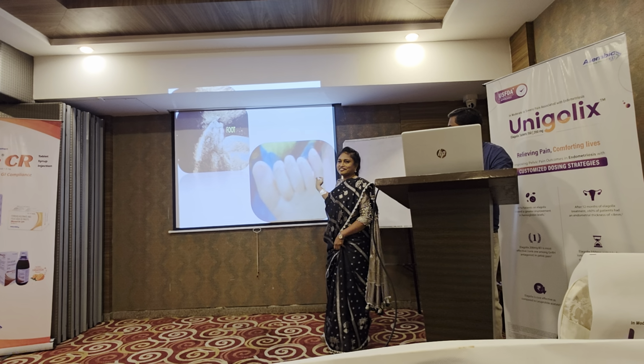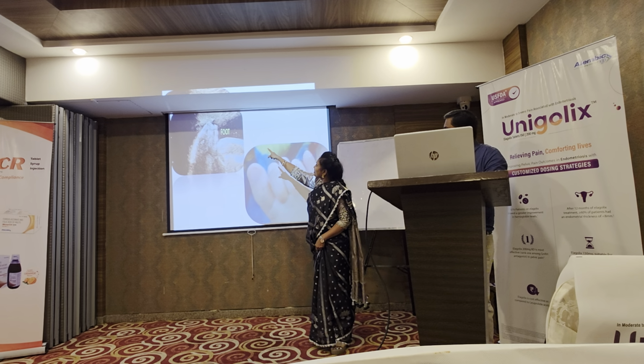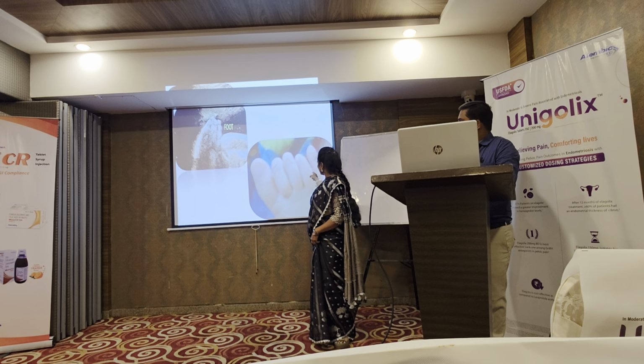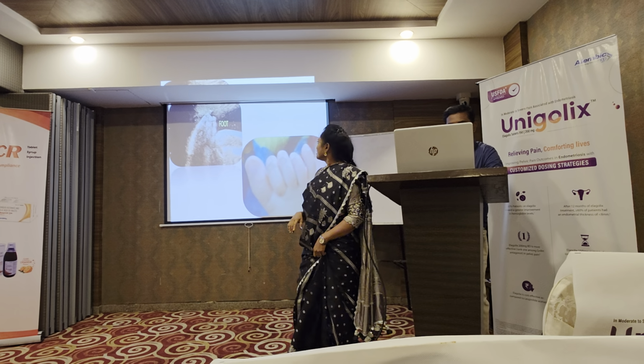Mother had a very severe variety. This one, it was there, and actually the bony one was scary. But to look, this was a milder variety, hardly noticeable. Next one.